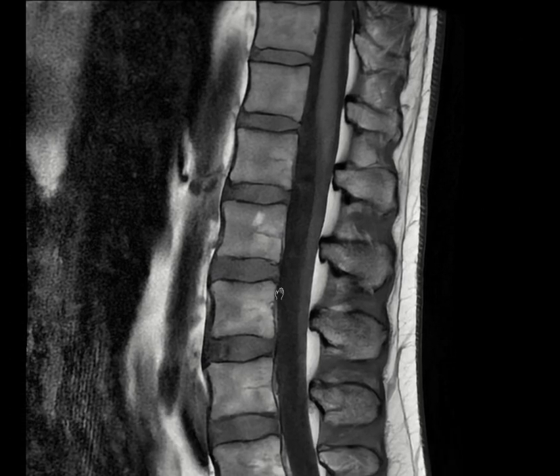This sequence right here is a T1 sequence. We see that the marrow signal in the vertebral bodies is bright because we have normal fat as you're getting older. You're going to have yellow marrow in your marrow structures, containing fat, and it's going to be bright. You're also going to see some fat in the subcutaneous soft tissue that is again bright. And in a T1 sequence, the spinal canal and the CSF are all dark, like the brain. So from the spinal canal being all dark, I know that it's a T1 sequence.